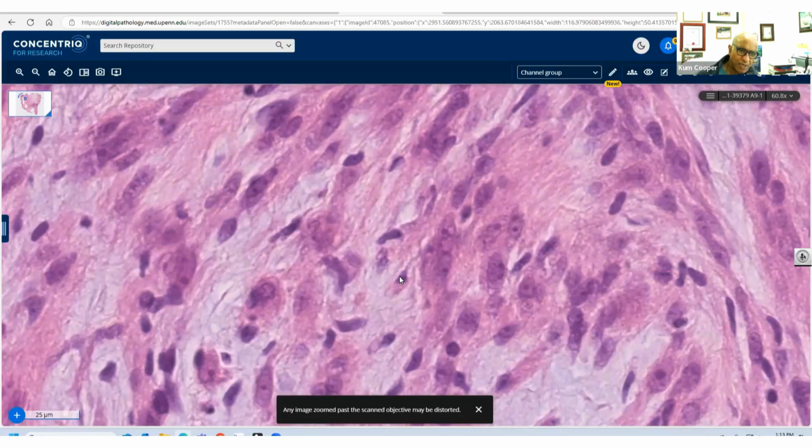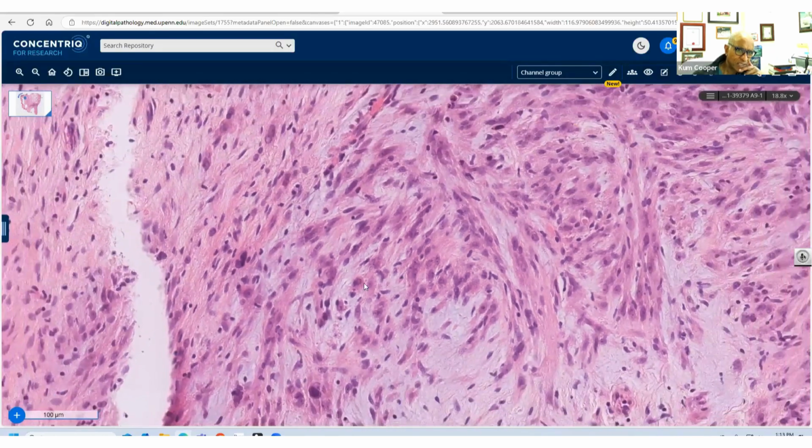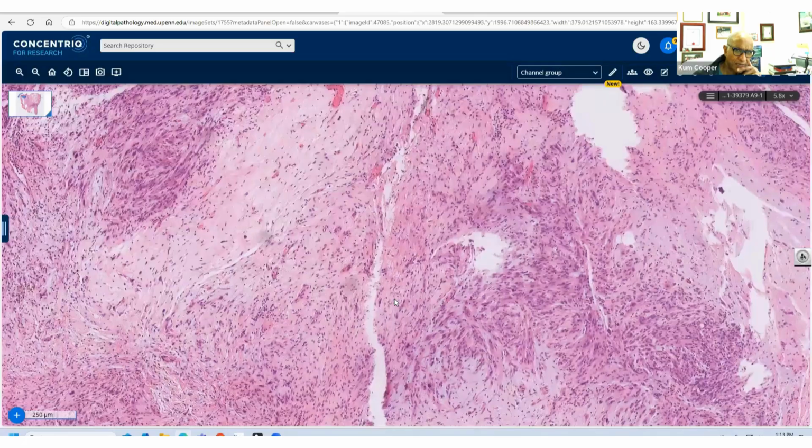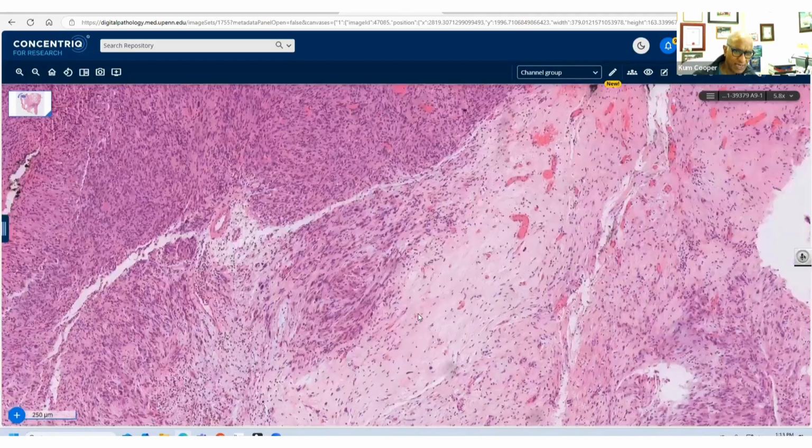So that's intact, but it doesn't rule out a nerve sheath tumor via the NF1 route, because only 60% of them are lost. So there is the 40% that you have to play around with and say, oh, well, could this still be an MPNST? So we're still in that realm. We're sort of getting down to nerve sheath tumors because of the S100 and SOX10, and the absence of the true melanocytic markers. And we're now talking about nerve sheath tumors. We talked about the NF1 pathway.